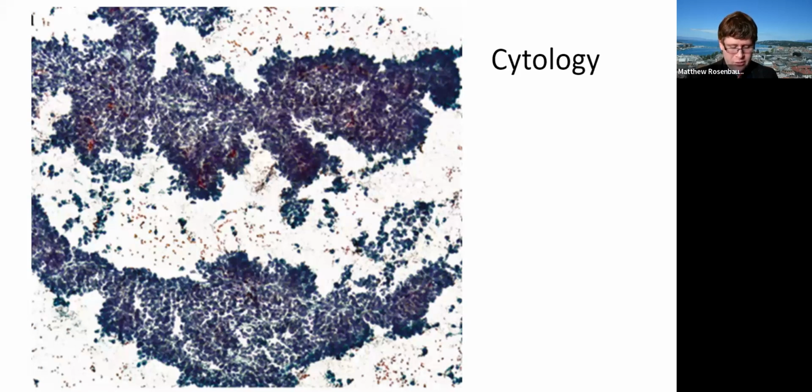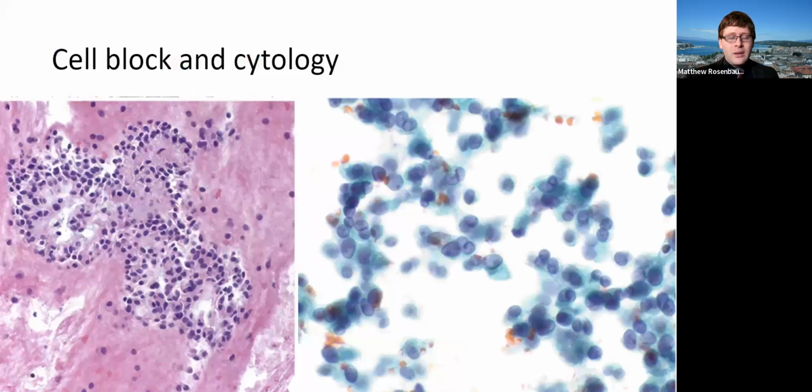If you look a little bit closer, you can see that they are very cleared out on the right. They have clefting, and some of them have longitudinal grooves. You can see that there are pseudopapillary areas. You can appreciate the pseudopapillary areas on the cytology in the previous slide, and here you can see it on the cell block as well. You could do IHC here to confirm the diagnosis, which we did, but that led to the patient getting a resection, which Marla can show right now.